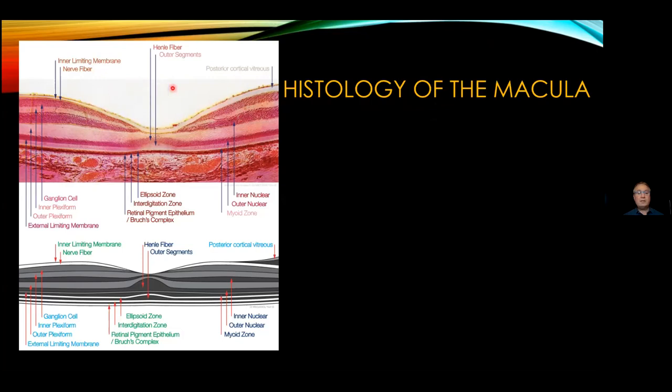So as you're aware, this is where the vitreous would sit. We've got the internal limiting membrane. We've got the nerve fiber layer, ganglion cell layer, internal plexiform, internal nuclear, and then the outer plexiform, outer nuclear. And it's normally this area here where the laser pointer is showing where the photoreceptors sit on the retinal pigment epithelium.